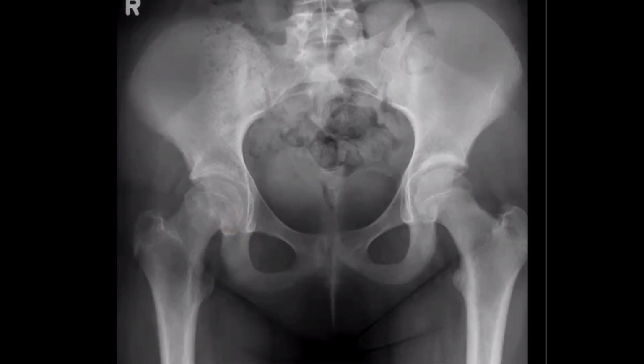No, sir. I don't know this sign. This is what we call the metaphyseal blanch sign. Metaphyseal blanch sign. Okay, sir. Yes. This one is very important because the femoral head itself, the epiphysis, rotated posteromedially and overlapped posterior to the femoral neck, and this overlap between the bones can create this sign.